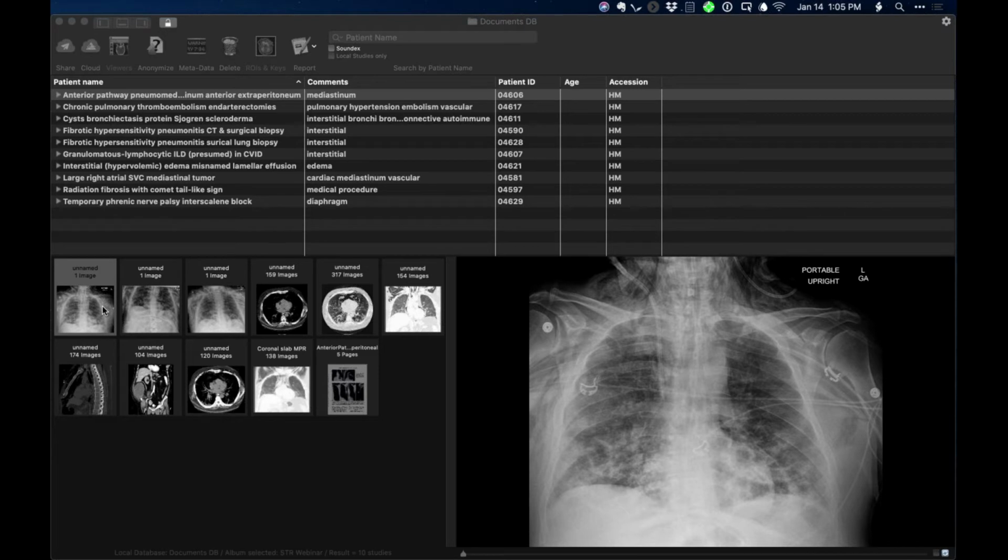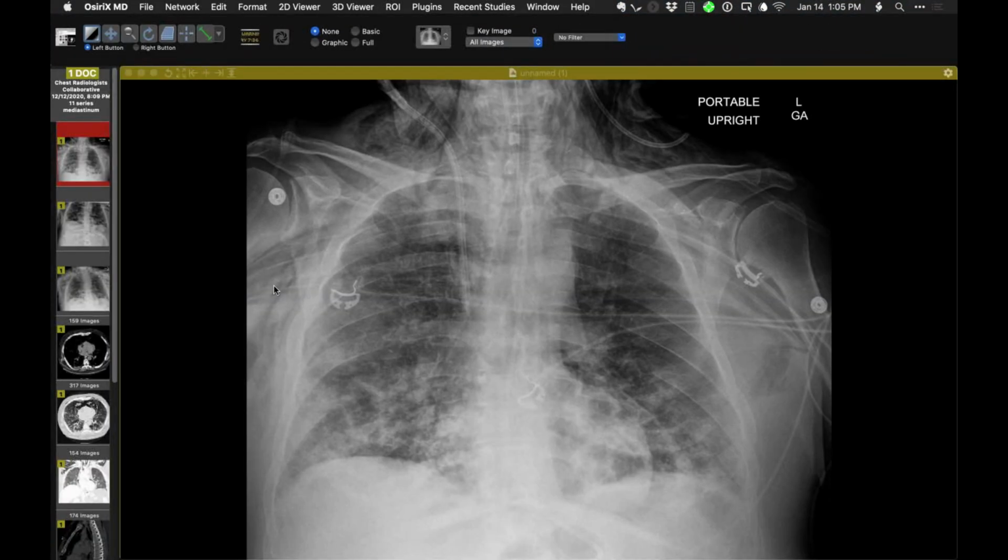Okay, this first case I want to show and discuss some findings related to the presence of pneumomediastinum, the chest wall subcutaneous emphysema supraclavicular, as well as air in the upper abdomen. And one thing that was on the report of a CT that was read here was a description of possible diaphragm rupture, which sounded pretty awful in the context of that report. And certainly there's no findings to suggest that.